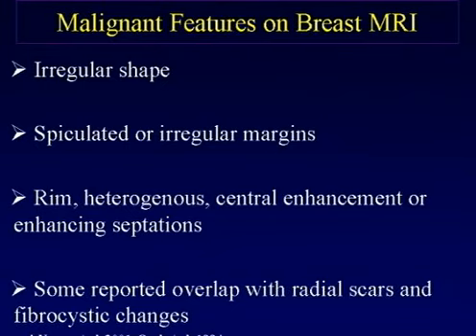Similarly, these features can be used to describe suspicious findings, like mammography and ultrasound. You can see an irregular mass or spiculated margins. But again, unique is this pattern of enhancement. I think it's just another way for us to analyze the mass.